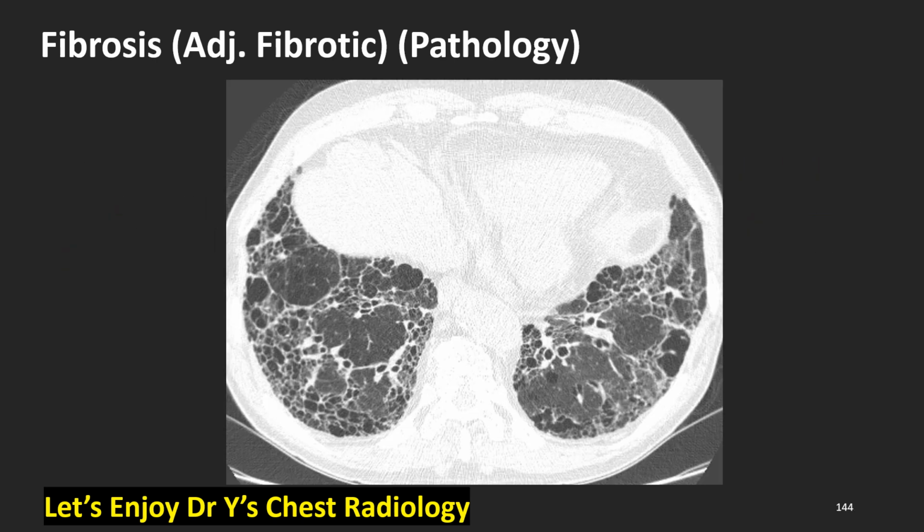Fibrosis, pathology. CT scan shows bilateral pulmonary fibrosis of an idiopathic pulmonary fibrosis patient.